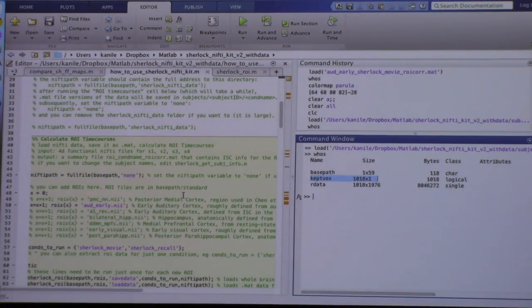The way I would recommend doing this in general is you make a mean image of your functional data, and then you plot a histogram of all of the voxel values. The actual magnitude of those values will vary from scanner to scanner. It's a completely arbitrary number. I've seen it in the hundreds, and I've seen it in the thousands. Those are the luminance values. If you plot a histogram of that, you're going to see a big spike at or around 0, which is all of the voxels outside of the brain that have no signal.